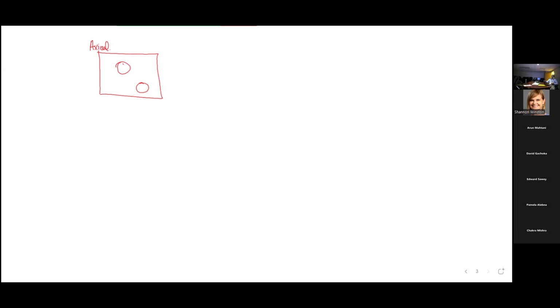And so our flow is equal to the area times the velocity. And if we take this image, and I'm going to change colors, remember, we've got these lines going through here, right, to make our images.